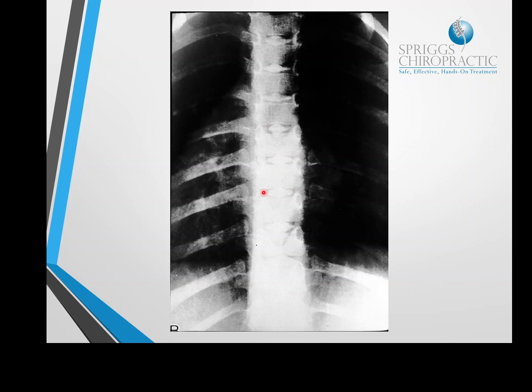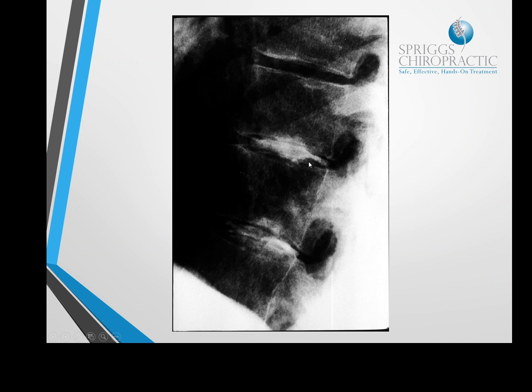We don't really know what's causing this to occur, but it's spread out throughout the thoracic spine. And again, here we have it in the thoracic spine, in the intervertebral discs. Not affecting all of the layers in this particular patient, or all segments in this particular patient. This is going to be the diaphragm. Just here, this is probably going to be around the T8, T9 region.